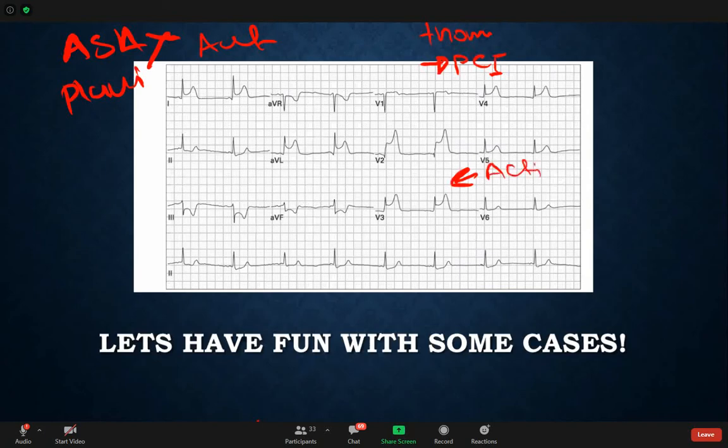He needs to go to the cath lab, right? Of course, let's go back and explain. We said we mostly have sinus bradycardia at a rate of 50 with a normal axis. We have ST elevation in leads V2, V3. Also, if you look at lead 1, there's an ST elevation in lead 1, right? And aVL, as Yusuf said.